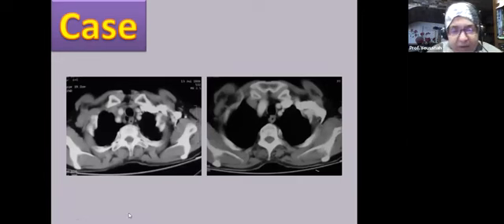Now finished with the esophagus. What do we have here? We have the trachea. Behind it, on the left side, there is the esophagus, and there is a lucency behind the trachea and beside the esophagus. As in the first images, you can see we don't have a sternum anteriorly. So this is the root of the neck. This is the inlet or the outlet of the thorax, okay?